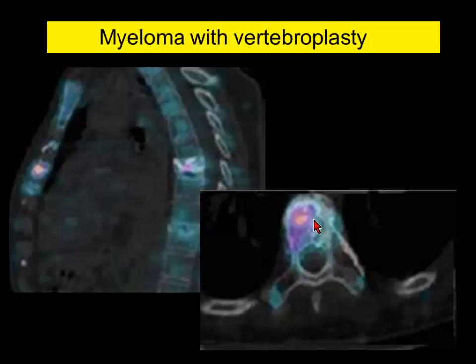There is no movement, but here there is activity and that is causing pain. So they had to go in and put another fragment here to complete the plasty. So it's important. You see, it's difficult on the plain CT or MR to say where the focus is, but with the fused images using the SPECT CT, it solves the problem.